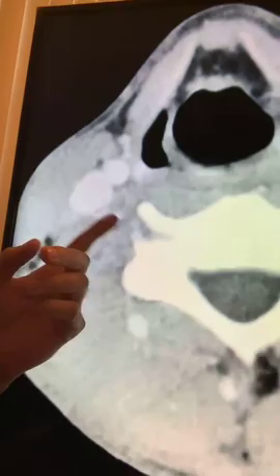All right, so we're just starting off saying, all right, we got a CT scan here. And then next, as a radiologist, you have to ask yourself, does this have contrast in it or not? Makes a big difference, right? So you got to figure out, is this a contrast opacified examination or is this not? So we look over here. How can we tell, right? We're looking at the vessels. So the vessels have contrast in them. So that's step 2. This is a contrast opacified exam. So we already knocked 2 things out of the ballpark. 1, it's a CT scan. Number 2, it's contrast enhanced.